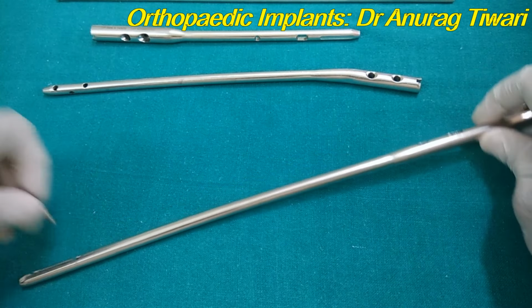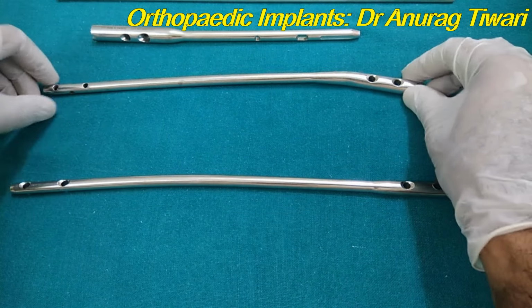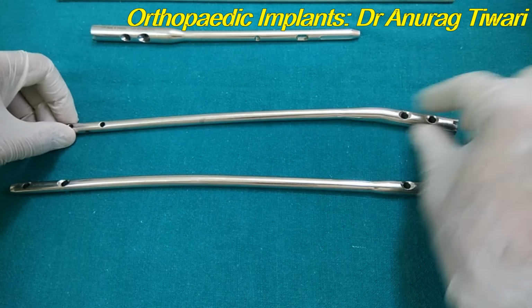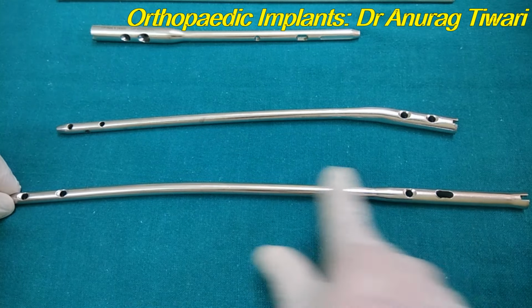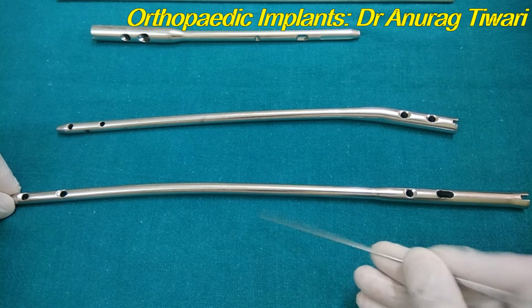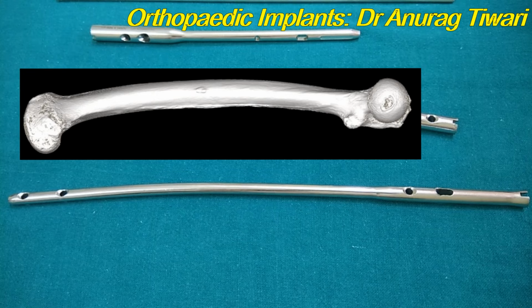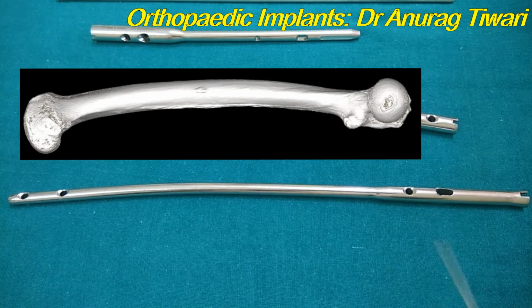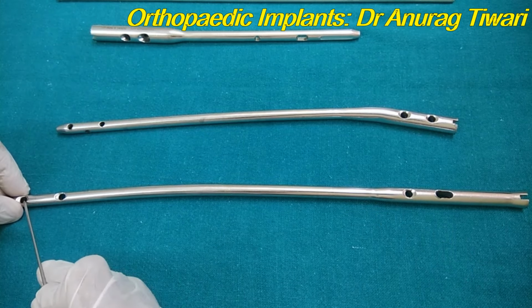And how to identify this nail? This is actually the femoral nail because there is no bend. As you see, this is the tibia nail. There is a Herzog bend in the proximal fragment. This is about 11 degrees. And this is the nail which has, you can see, the convexity. This is the anterior side and this is the posterior side. So there is a slight curvature in the nail to accommodate the curvature of the femur bone, because the femur is also bowed like this. So this is the femur nail. You have two interlocking holes in the proximal fragment, two interlocking holes in the distal fragment.